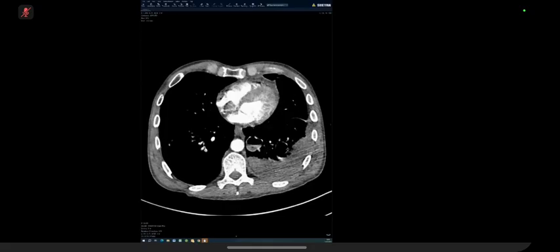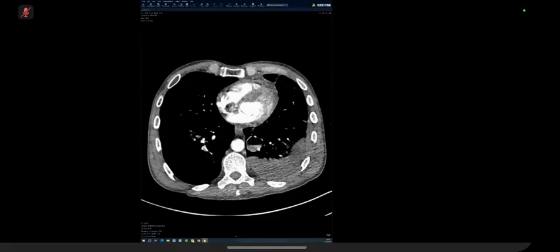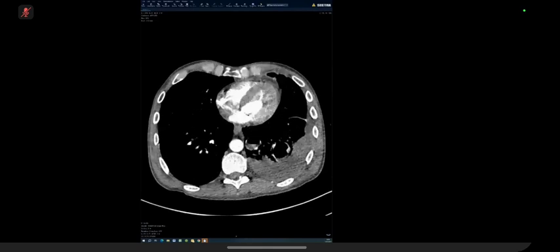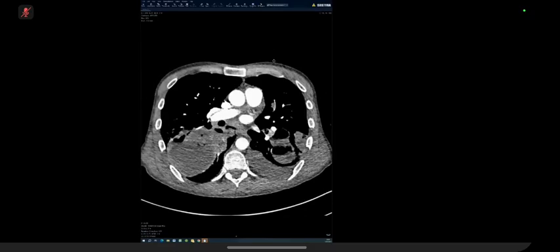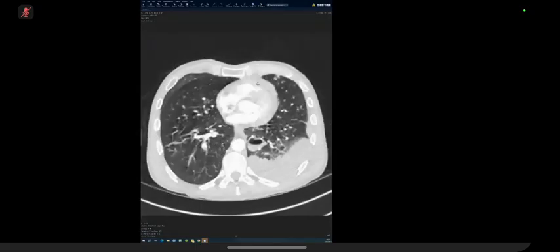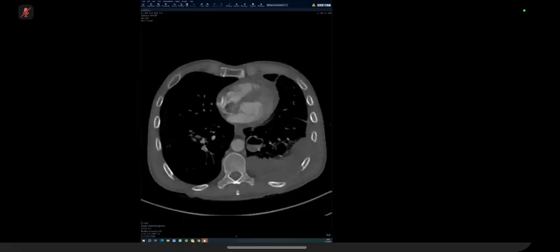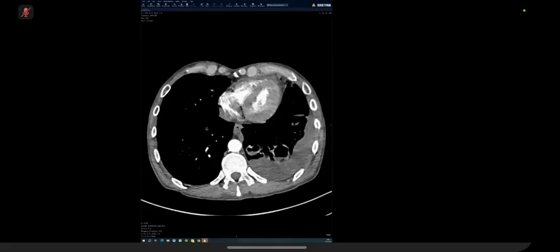Do you think the patient has a PE? Yes or no? At the level of the right lower pulmonary artery, I can see a filling defect. Mm-hmm. I want to trace the rest of the pulmonary vasculature, but I can detect evidence of septic emboli here in the right lower lung. Okay. If you had to ask one question about the history of the patient, what would you ask?